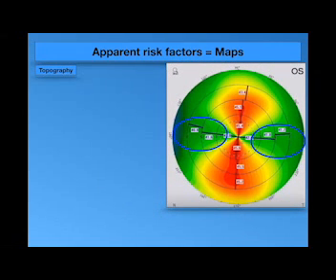But when you have any topography or the Pentacam maps, you have to first check the reliability of this test, if it's reliable or not, if the patient acquisition is good or not. This is the first point to be sure that it's reliable. Otherwise, you will ask for recapturing again. If there is misalignment, if there is deviation of the eye, if the patient is not concentrating properly on the target point in the device, you will check all of that to get a reliable test.